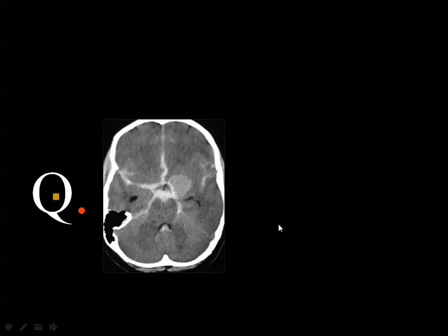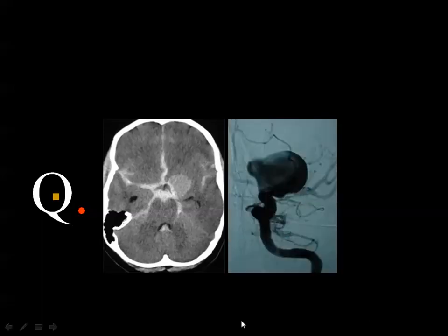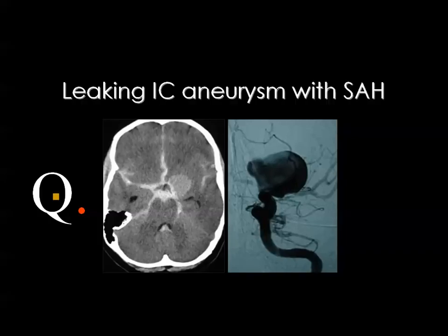And this aneurysm is leaking blood in the subarachnoid space, and the confirmation was obtained by selective angiography of the carotid artery, and you see the aneurysm itself. Then you should expect that the aneurysm will be of relative hypodensity compared to the blood in the subarachnoid space, because there is minimal flow inside the aneurysm. Okay.